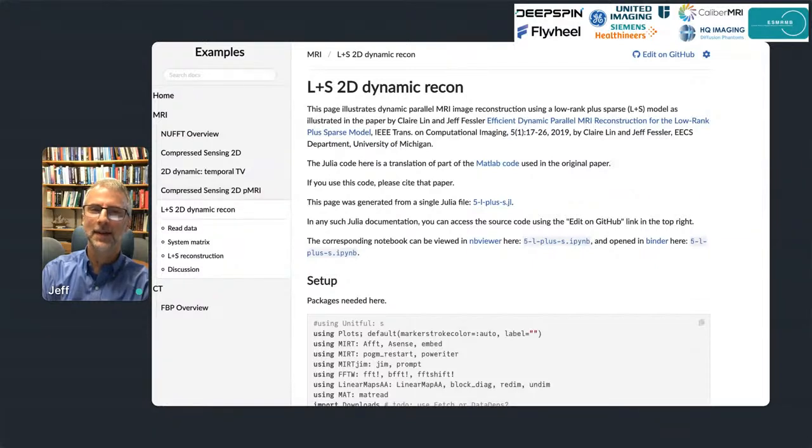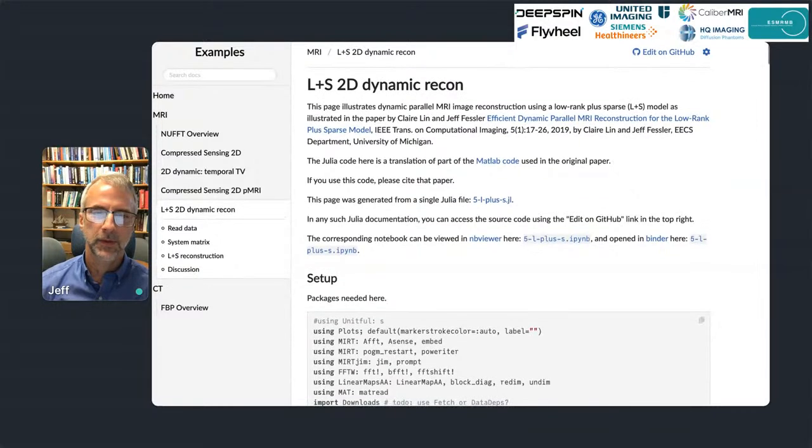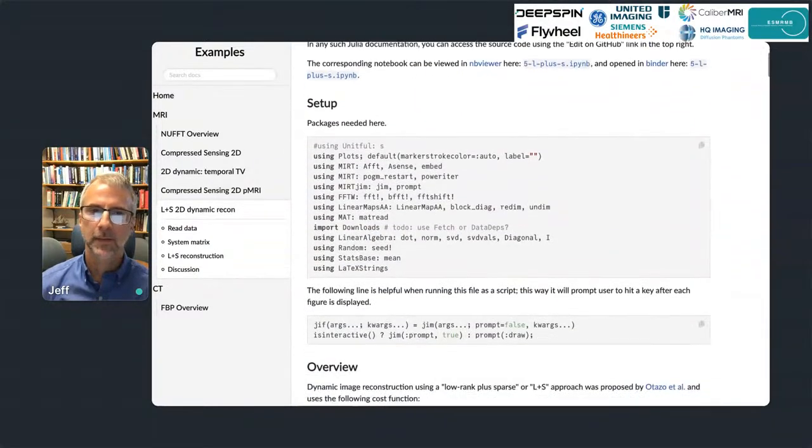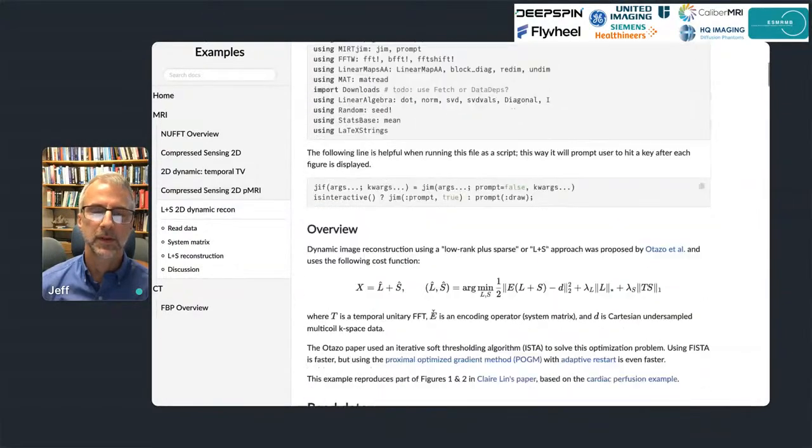and the Julia comments have in them the markdown that leads to this HTML page that you're looking at here. And I really like, it's kind of like a Jupyter Notebook, but one you can just view in your browser without having to open a separate application to see the Jupyter Notebook. And I'm a very visual learner, so I really like to be able to read in an environment where I see the math, I see the code, and then eventually here we're going to see some images.